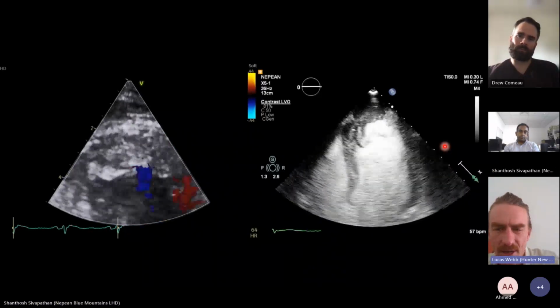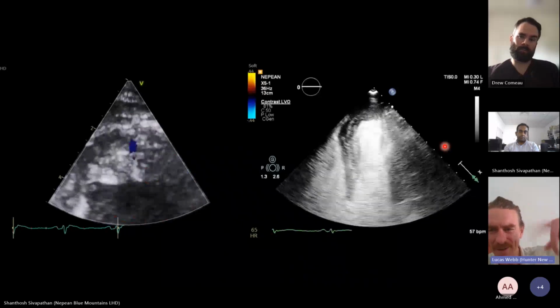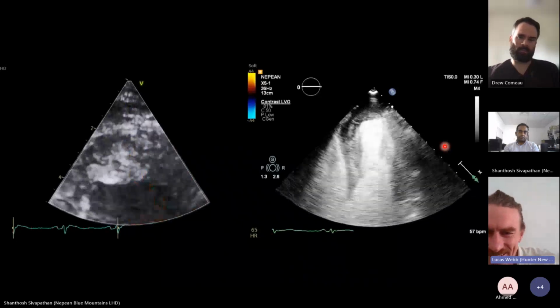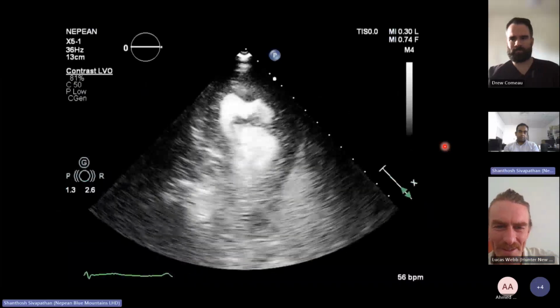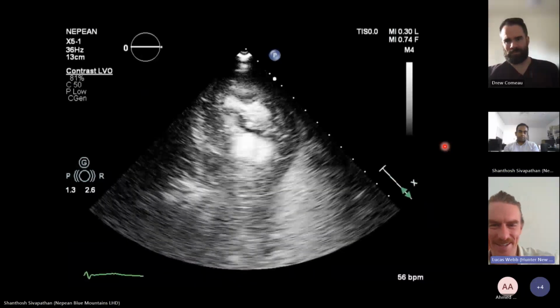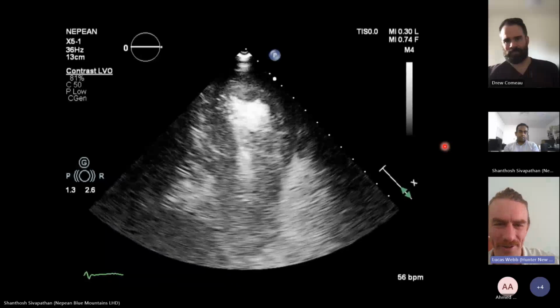So look, I would say, yeah, it looks like there's a little fimbriae of something. Maybe that's just the swirl of how it's flowing. Can't say now. I've looked at too many contrast studies. That looks like there's definitely something floating around in the middle there.